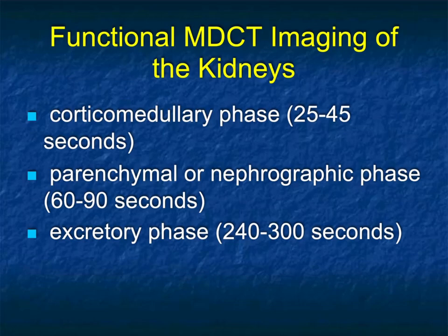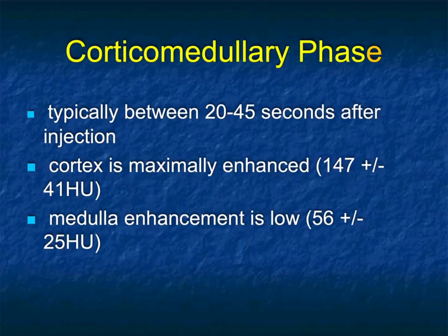A specific lesion in the kidney, if I look at it at non-contrast, or I look at it at 30 seconds, or I look at it at 70 seconds, or I look at it at 4 minutes, will look different. Each of those different time points will give us different information, and putting all that information together really allows me to make a very specific diagnosis. So let's first talk about cortical medullary phase.